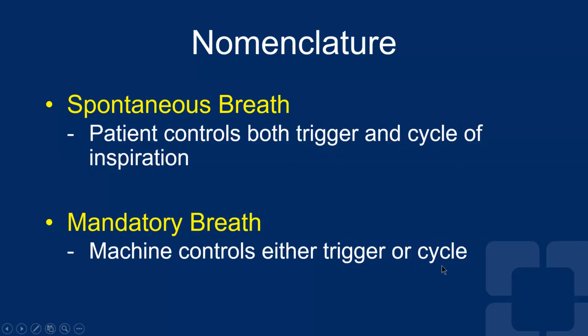This is important because we have used the term flow starvation, for example, or flow desynchrony, to describe this relationship between the pressure from the ventilator and the pressure of the muscle. Here you will see that we use the term work shifting, and we'll talk a little bit more about that.